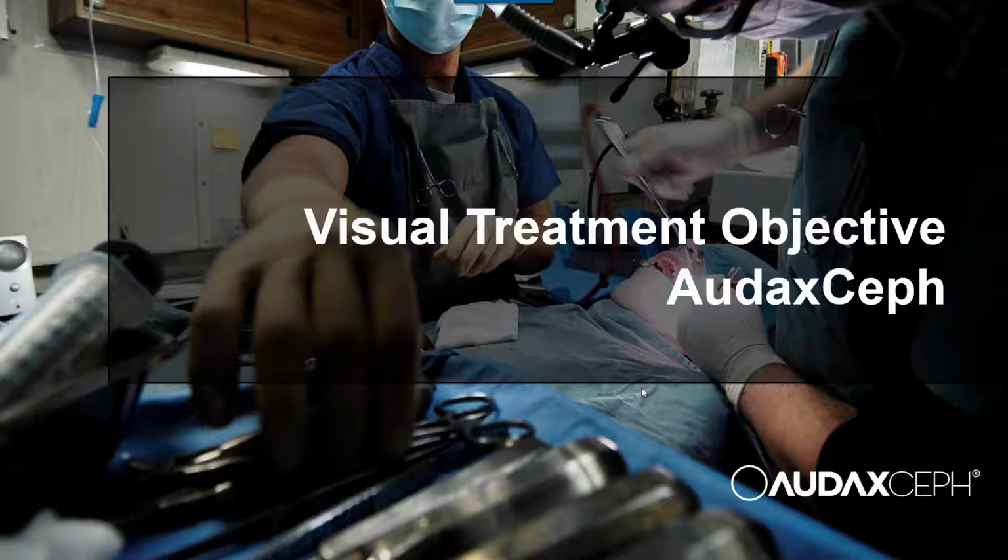We will talk about cephalometric visual treatment objective VTO and how to use AudaxCeph for the purpose of planning, predicting and simulating the treatment. We will also show the direction AudaxCeph is heading with its cephalometric tools, what is being developed, and we expect you to have comments on that.